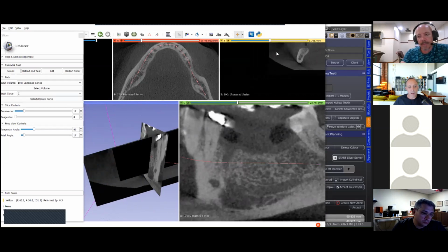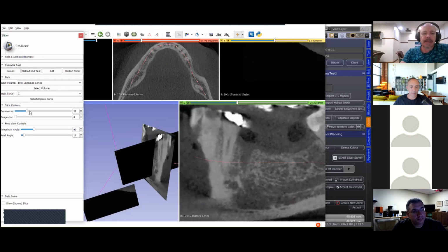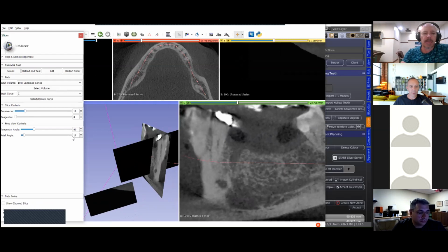Just a question. You've got another transverse on 17 degrees. Can you take that away, or is that possible? This is the one that slides. I'm not quite sure what this one is doing here at the moment. All right, no worries.